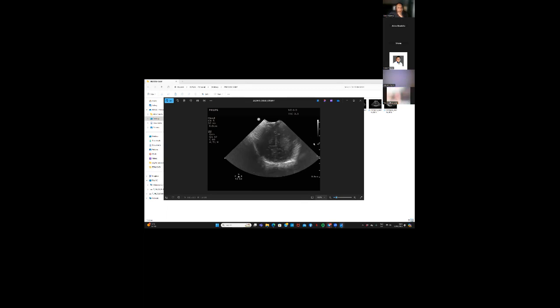And this is C6 going posterior most. A little bit more bright on the left than on the right side. When I look at this image, it'll be very interesting to see the trigonal view when we look at the left side in your sagittal sections.